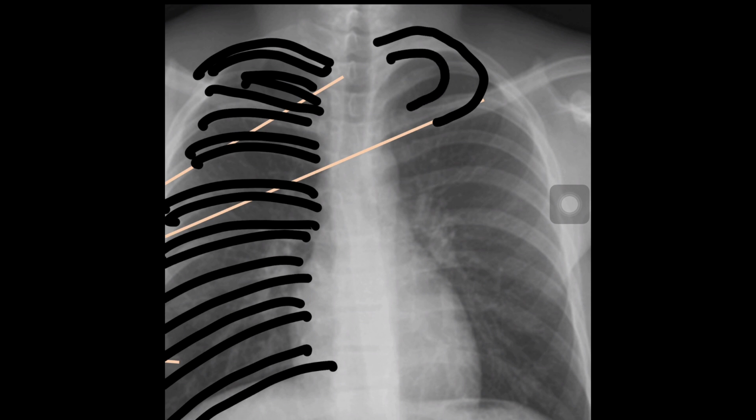This is a trap, you must not fall into this trap, okay. Second rib is this, okay. Like that you have to see all the ribs.